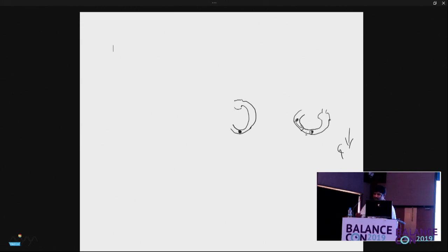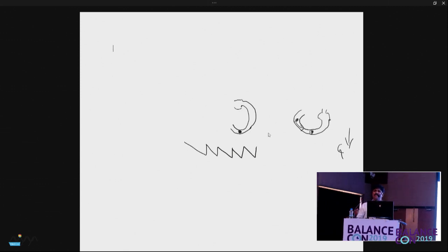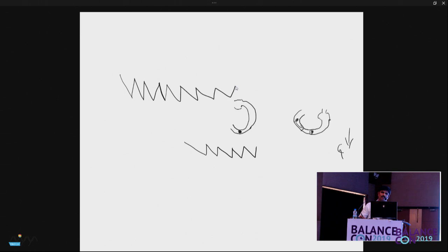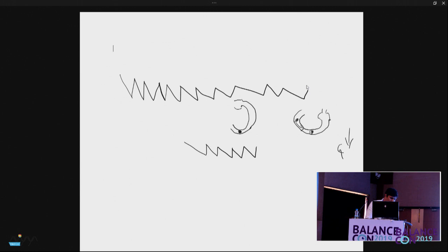Can you make out a right beating nystagmus? Isn't this nystagmus looking like this? In the beginning, it is so intense that the slow component and fast component look almost the same, but as you keep seeing it, the difference becomes manifest. Correct? Can you see that? As you progress, it becomes more manifest.